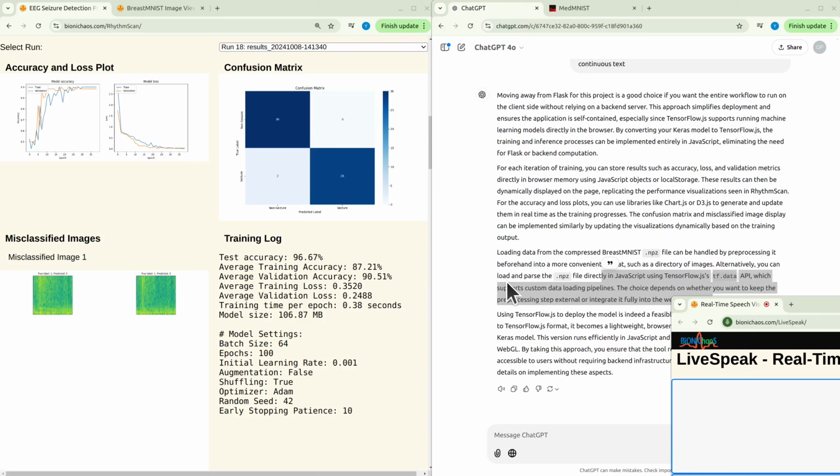Yeah, I'll just quickly share with you some code, and I just want you to quickly comment. It's really for your reference. We might need to redo the code from scratch. So first is the rhythm scan that is already deployed and running. It's running well, so we're not making any changes there.